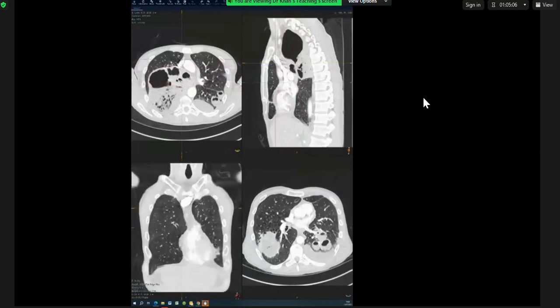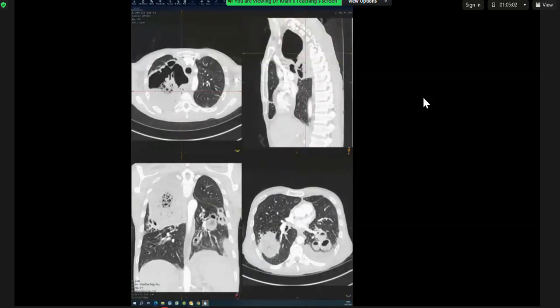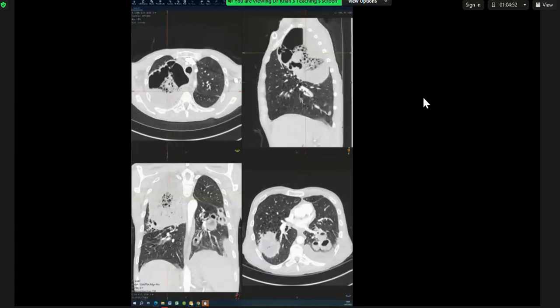In my opinion, this fits more with lung abscess. Okay. And this thing floating inside it, what is that? This may be a pus component, or maybe the rest of necrosis in the parenchyma.